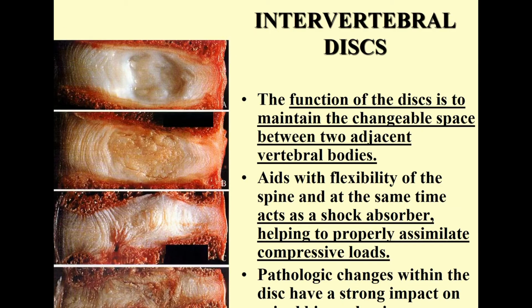This is just a remarkable group of images, obviously not of the same patient, but at the top we've got this very healthy disc. You can see the crisscrossing bands of annular fiber containing the gelatinous nucleus pulposus in the center. This is obviously an older patient where the disc has started to dehydrate. We will talk about MRI imaging of a healthy to unhealthy disc, and one of the key markers of an unhealthy disc on MRI is the evidence of reduced fluid or water, or dehydration.